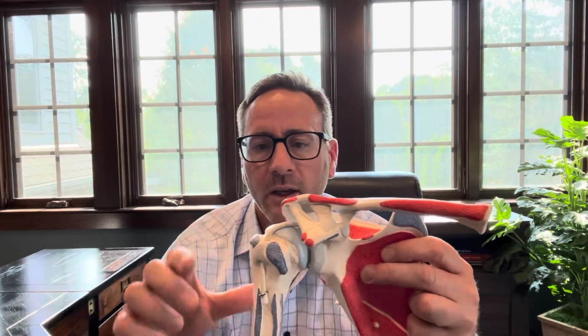The rotator cuff is important to the shoulder in that it creates compression of the ball to the socket with shoulder motion. So as the shoulder elevates using the big muscle out here called the deltoid, the rotator cuff centers the ball on the socket to allow elevation. When you have a rotator cuff tear, sometimes there's superior migration or translation of the ball on the socket. So when you rotate, the deltoid shortens and the ball, instead of rotating here, translates up and hits this bone and can cause discomfort. So when you're deciding between a standard shoulder replacement and a reverse shoulder replacement, the rotator cuff is important.